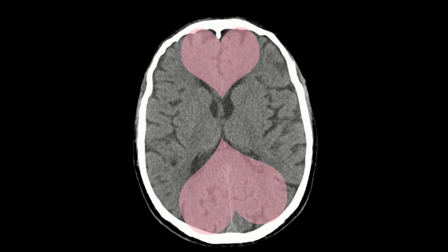So this reminds me of that. So at the anterior end, that would be the anterior cerebral artery area, and back here would be the PCA region, and the rest of it is MCA.